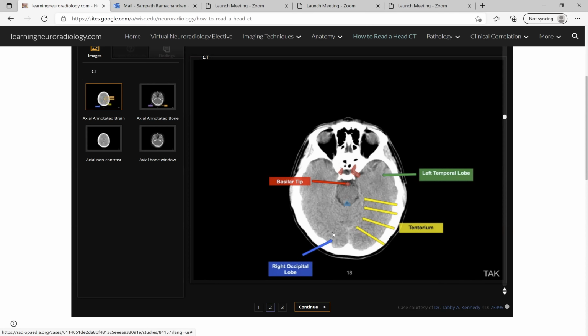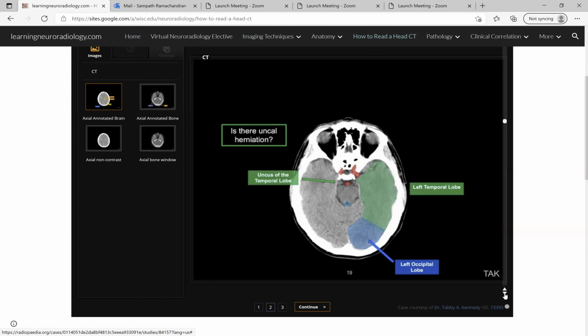And here we are coming into a portion of the right occipital lobe. This is extremely important, as you know, the visual cortex sits here. So this is a very important part where you can get strokes. You can develop other kinds of pathologies which can affect your vision. It can cause other symptoms like headache and problems with other parts of your visual cortex. Essentially, these can get affected if you have pathology there. So let's get through a few more slices here.